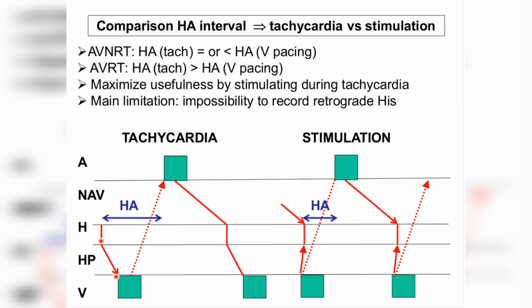Now, part of the ventricle up to the ventricular insertion of the accessory pathway, and up going through the accessory pathway to the atrium. This is a ladder diagram. I hope you are familiar with this. We have represented here the atrium, AV node, His-Purkinje system, and this dashed line represents the accessory pathway.